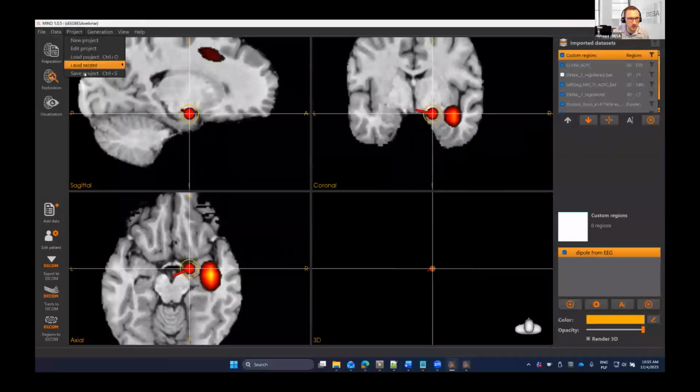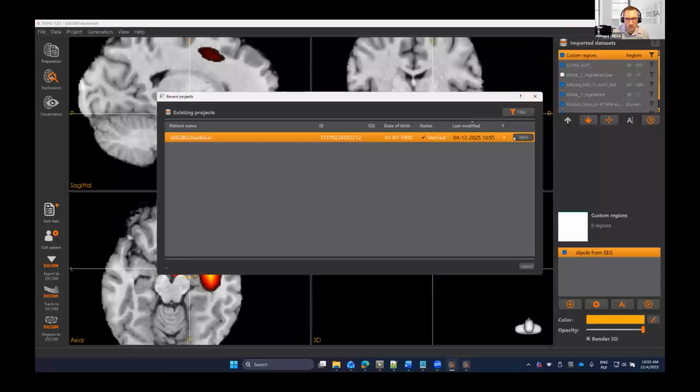So we close the project, or actually load project.